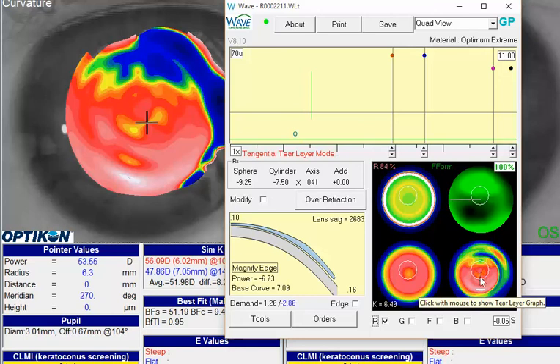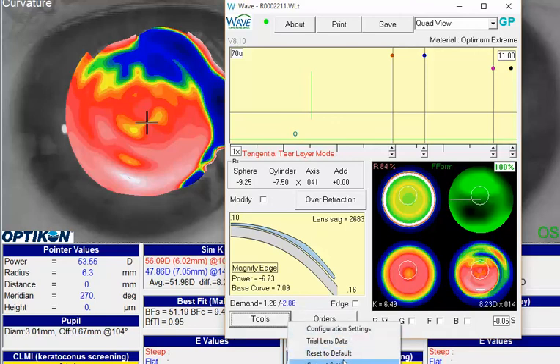As far as powers go, you're also working with a very complicated prescription on a very complicated cornea. Sometimes what I'll do is fit a lens like this using RSIM to simplify the optics, and then place that lens on the eye, get an over refraction over that particular lens, and then plug that back in over here under tools. If I can, either under over refraction, or sometimes if I use a trial lens, I'll use the trial lens tool. So hopefully you find that helpful.